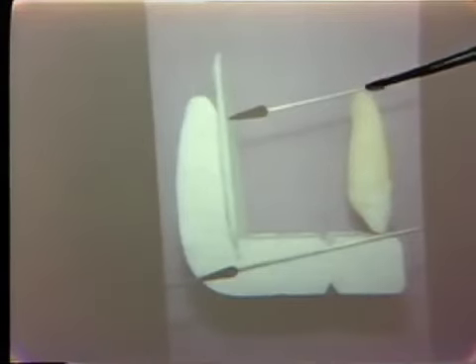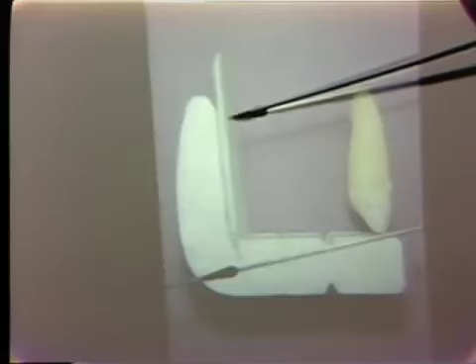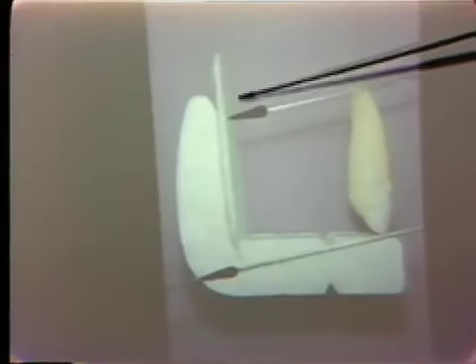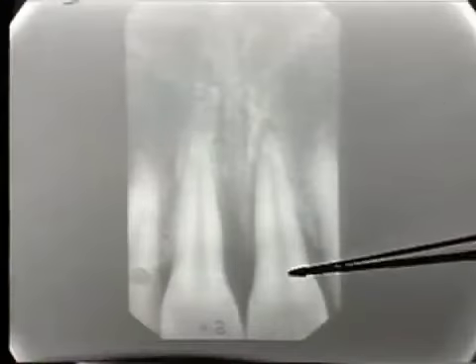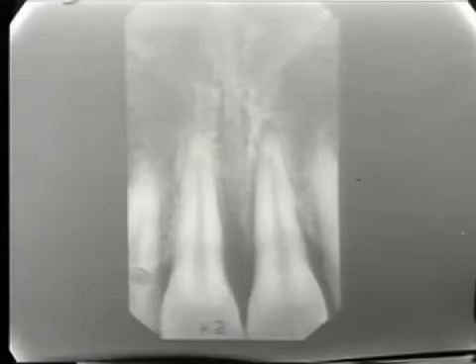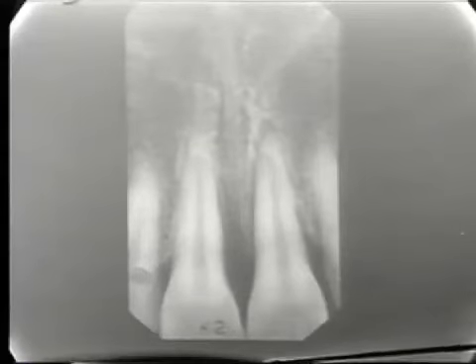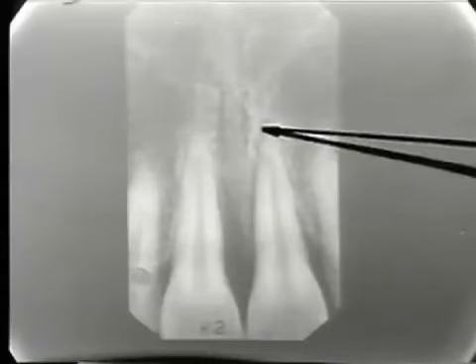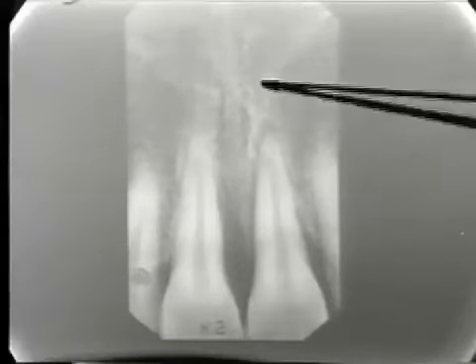And at the same time, the apex is cast a little lower on the film, enabling us to see details located a little higher in the mouth. The type of result that we get is shown here. The incisal portion simply does not show. There is no black border, and the region that shows above the apices has been increased.